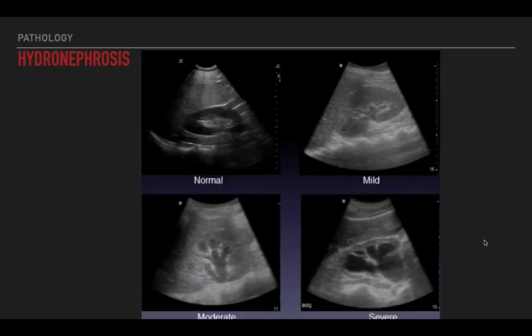So we've talked about hydronephrosis. Once again, this can be a very confusing topic, so let's talk about it one more time. Remember, your kidney generally has a hypoechoic parenchyma that is made up of your cortex as well as your medulla, and then the more hyperechoic center in which your vasculature and your lymphatics are housed, and within that is also your collecting system.